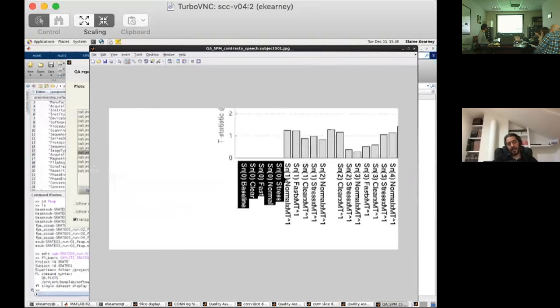So what this is telling you, by not being estimable, is that if you add 5, or add 10, to all of the numbers that you get in the beta images 1 through 5, and then you decrease by 10 the beta image corresponding to the session average, you're going to get exactly the same fit. So the actual numbers that you get from these beta images are not uniquely defined. They have some redundancies in them.